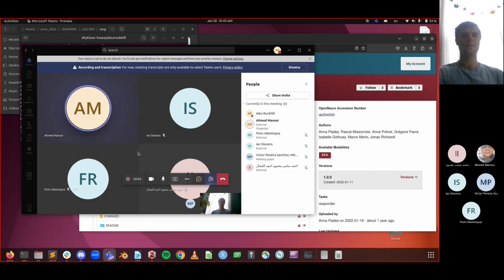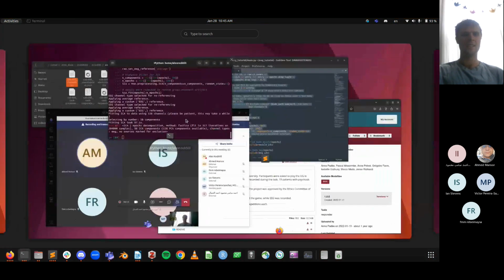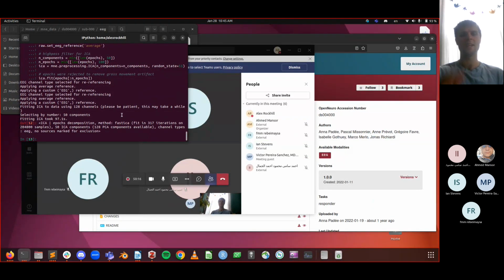Sounds great. So the ICA is still working in the background. Oh yeah, it's finished. And it does tell you how long it took, 97 seconds.